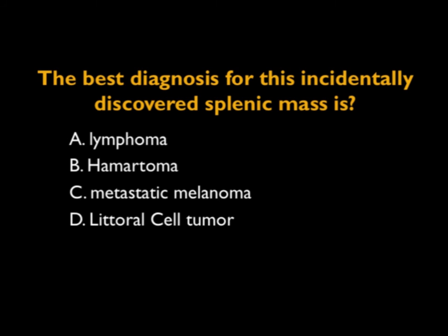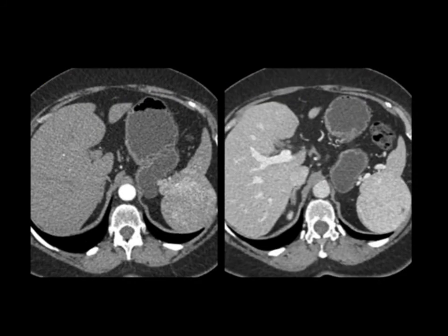The patient had an incidental splenic lesion, and I always like to say that most splenic lesions are indeed benign, surely if they're incidental findings. If a patient is febrile, then you think about abscess, but incidental finding, here you see a mass that's somewhat vascular, and what's unusual about the mass is it changes the splenic contour. It's like a large bulge off the spleen, but on delayed phase imaging, it's homogeneous, and it matches the rest of the splenic texture.